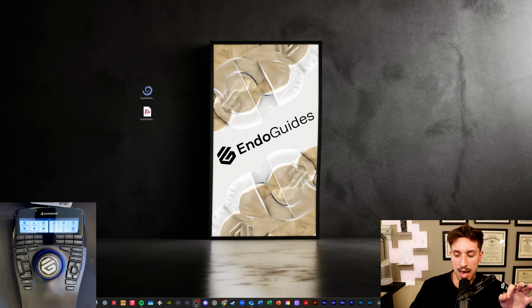The files that we have today are actually from ProDigiDent. I'll have a link to them below. I found these online. If you want to follow along, or even better, you can be doing these for your own patient. Now, with any sort of digital implant planning, what you're going to need is two things.